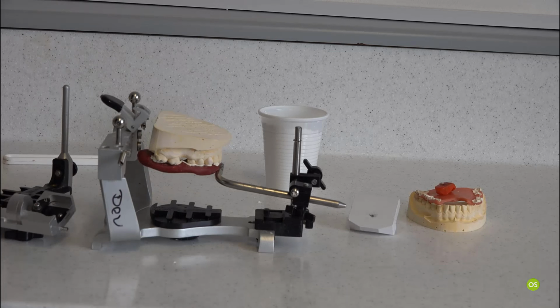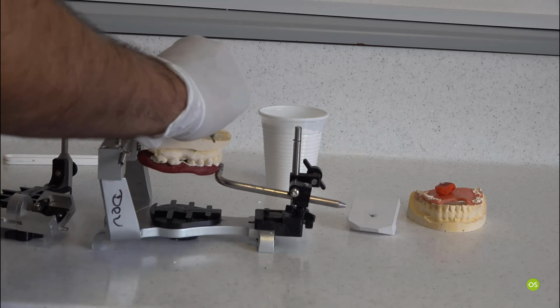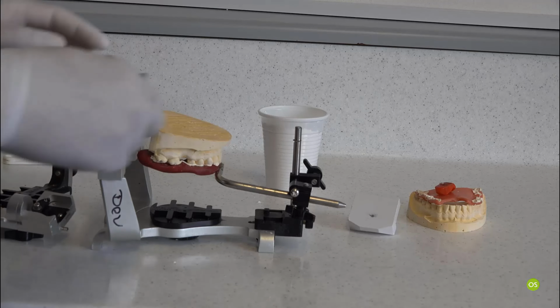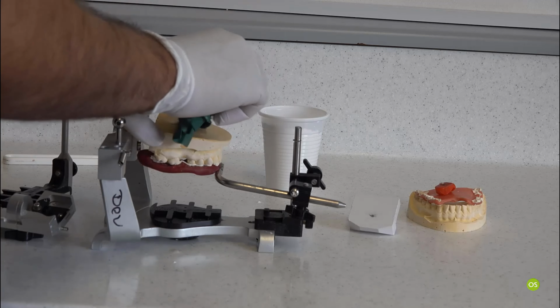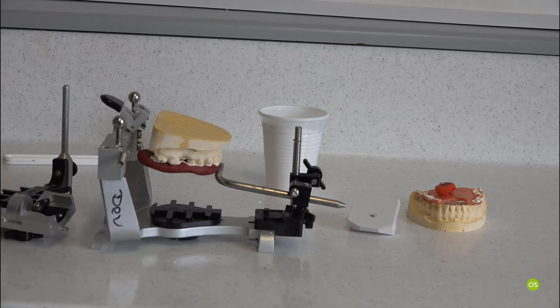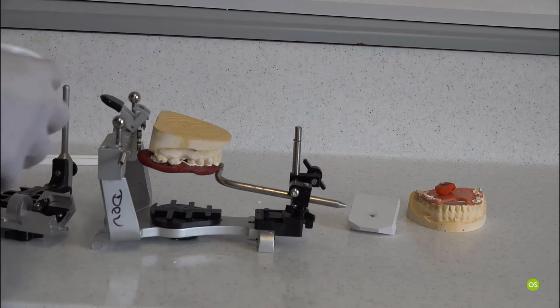Okay, so once you've done that, you need a wet tissue and you can just put it on top to make sure that the model is nice and wet. You don't need to put the model into the water because otherwise you can have issues with the articulating surfaces, and your teeth can start abrading. So you just want to gently drop a few drops of water and make sure it's nice and wet. You don't want a puddle of water, just a tiny bit will do. Once that's done, you need to get some water in the bowl and start mixing the plaster.